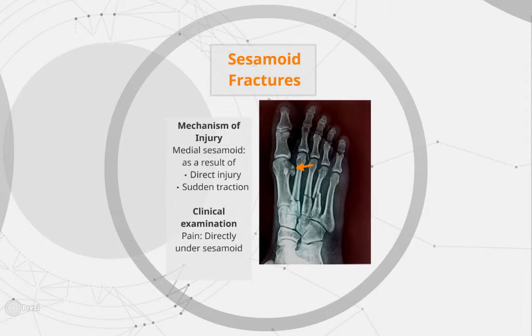This patient had a history of a road traffic accident, and fractures are seen in the shaft of the second, third, and fourth metatarsal bones, with a transverse fracture of the sesamoid bone adjacent to the first metatarsal.